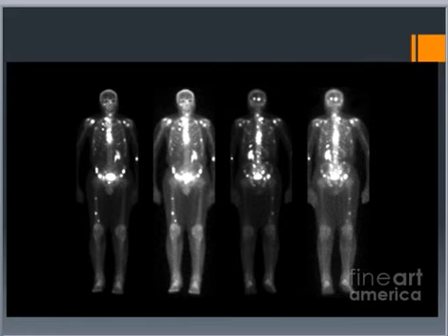This was a bone scan with a patient who has Mets. So you can see the hot spots in the right femur here. You can see them in the elbow, the pelvis area, the spine, the shoulders, and then there's 2 spots in the brain. You can see it a lot better on the posterior views. The orbits kind of hide it on the anterior view. You can kind of see them, but that's why we do the different views. But unfortunately, this patient has cancer throughout their body.